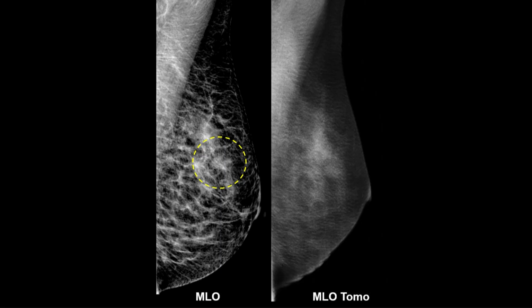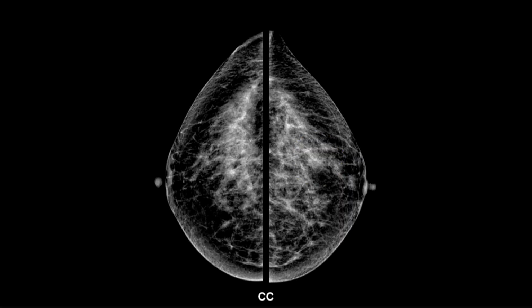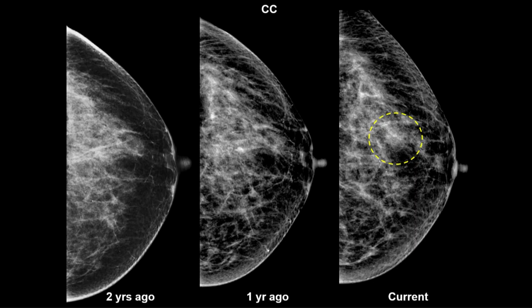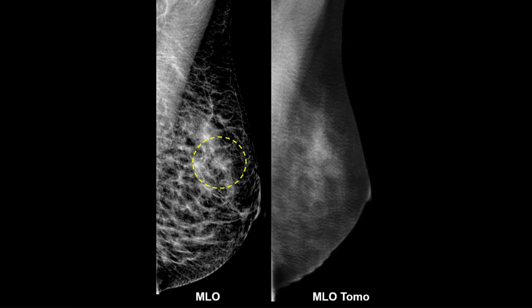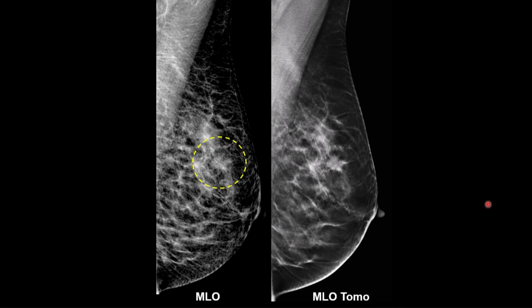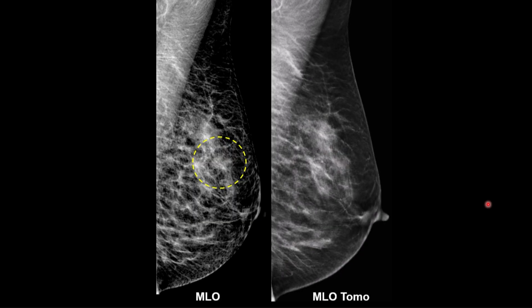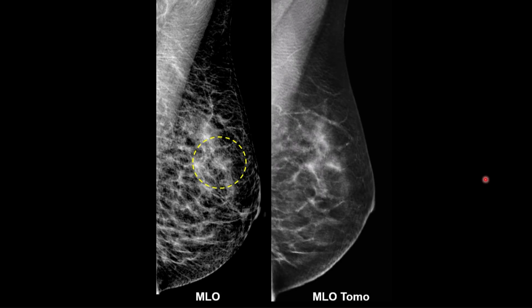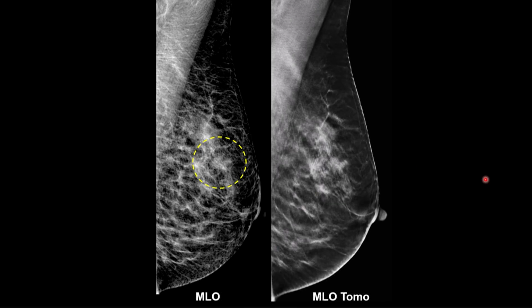We hadn't done Tomo, so we're going to do, wait a minute, which case number is this? This is we did do Tomo. And I'm going to not show you the movie. Or actually, I'll show you the movie and look carefully right where that circle is. There. Did you see it? Look right here. The movie will replay. There. Okay?